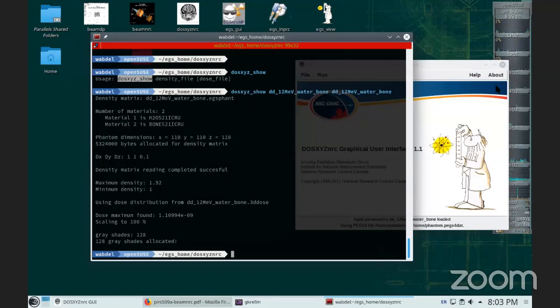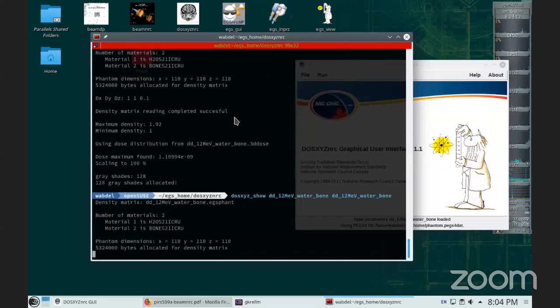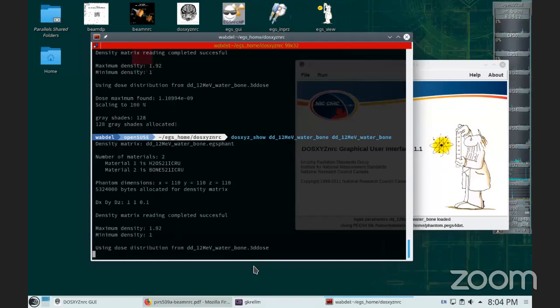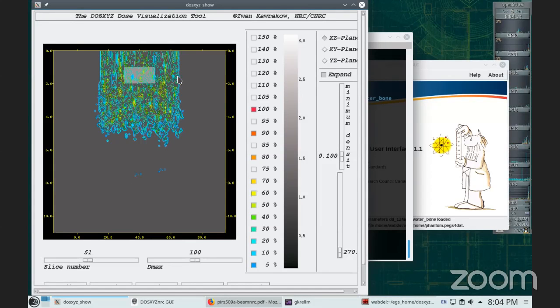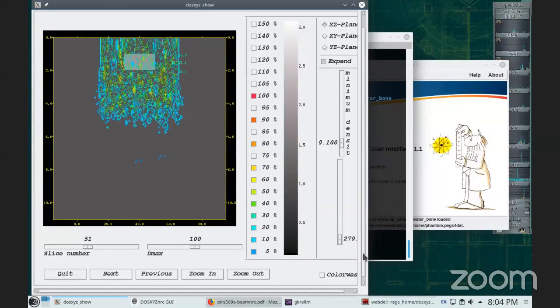Can we display those 1, 2, 3, 4%? You mean select the isodoses? Bilal, please speak, if you have the microphone on your side. Here you mean this 5%? Actually, I noticed when I click on something, it gives me the value. That's something new because I don't use this application a lot. So when I'm clicking on a certain voxel, it's giving me a value. Okay.